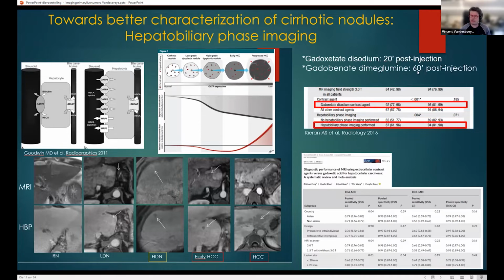Of course, within this hour, they are taken off the MRI machine, we scan another patient, and then these patients are put back for the last scan. What is the advantage? Also, it increases sensitivity for detecting hepatocellular cancer. And as you can see, it is quite easy. Again, regenerative nodule, you don't see anything. The low-grade dysplastic nodule can be hyper-enhancing or shows nothing.